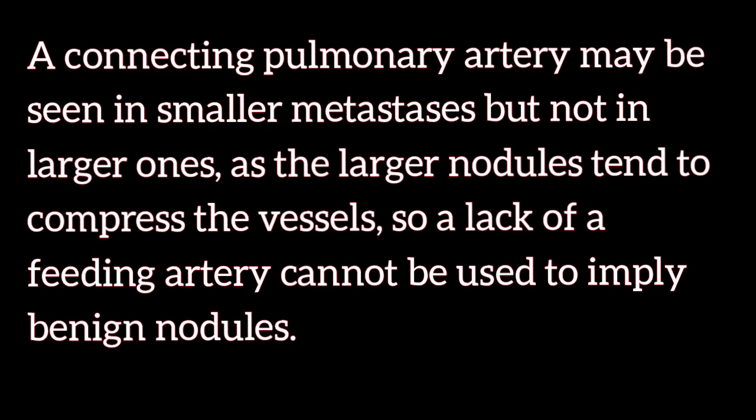A connecting pulmonary artery may be seen in smaller metastases but not in larger ones, as the larger nodules tend to compress the vessels, so a lack of a feeding artery cannot be used to imply benign nodules.